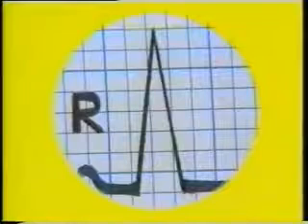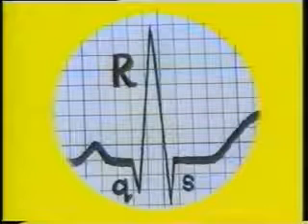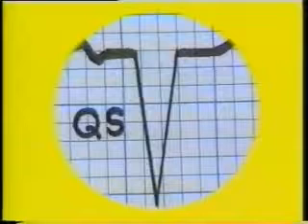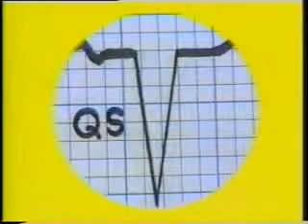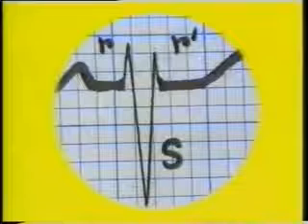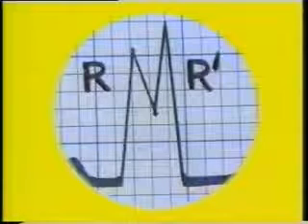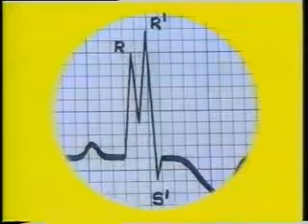This is a R pattern with no Q wave, no S wave. In this complex we see a small Q wave, a tall R wave and a small S wave, a QRS complex. And in this complex there is only a downward deflection, no R wave. We do not know whether it is a Q wave or a S wave, so it is termed as QS complex. This is a RSR dash with a deep S wave. This is a RSR dash with a tall R dash wave. This is a RR dash pattern, and this is RR dash S dash pattern.